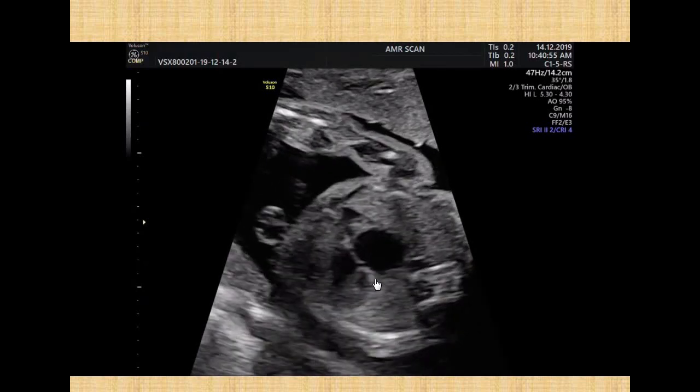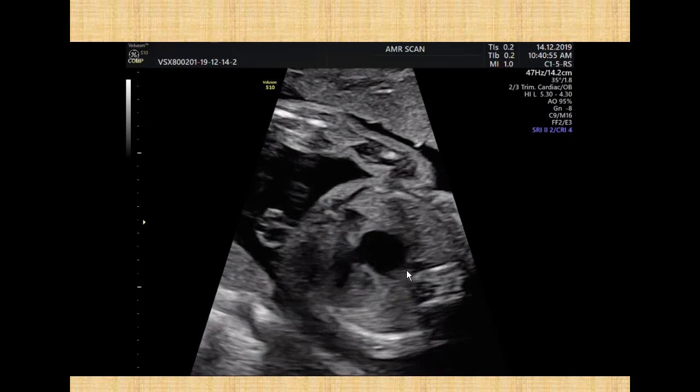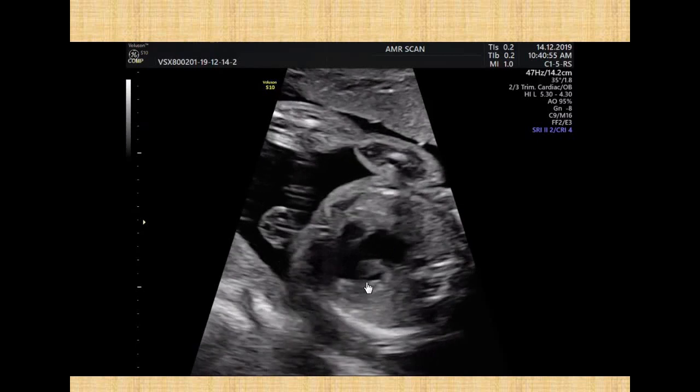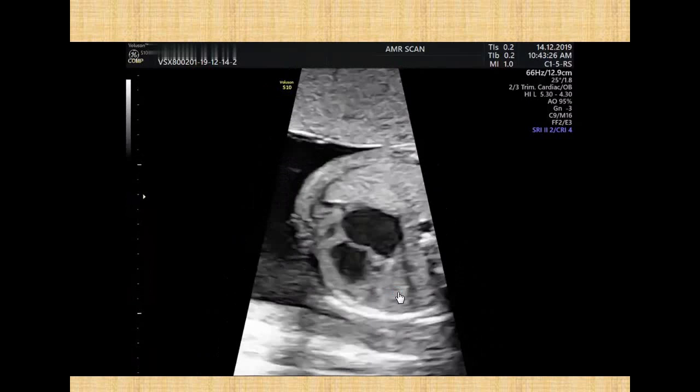and the interventricular septum. And you will notice that the atrium has a common atrial morphology with complete atrial septal defect, and you will notice again in the following clips there is a small inlet VSD, apparent right here, with absence of the crux.